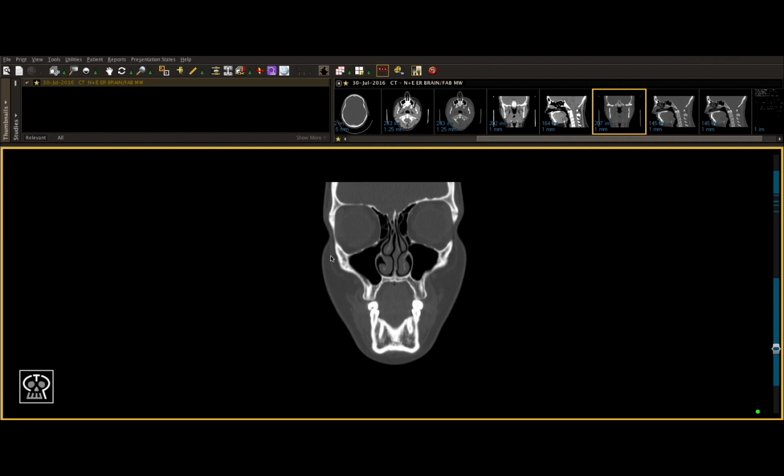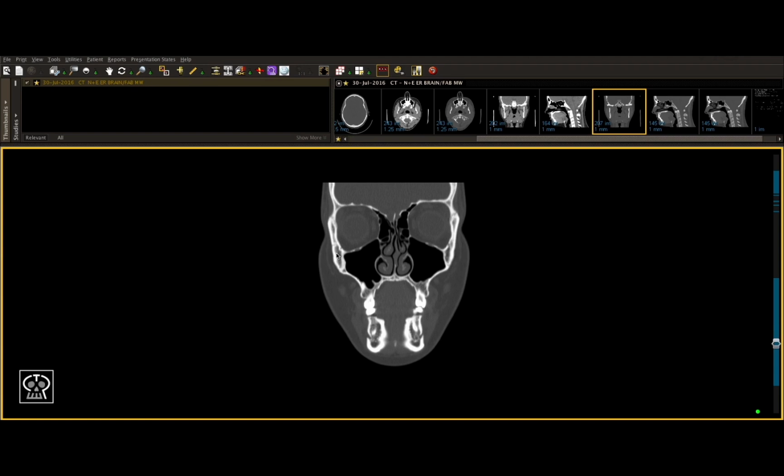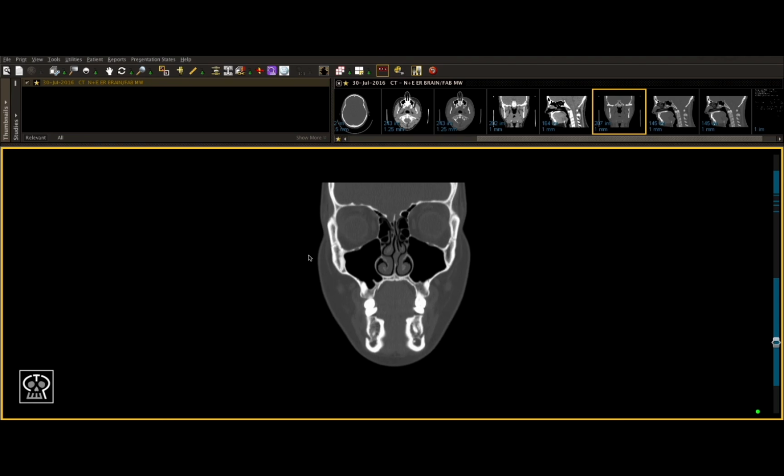These are all done one at a time, and as you can tell, there's an intricate relationship with maxillary sinus fractures, orbital wall fractures, and zygomatic arch fractures. This is why, once again, similar to your NOE fractures, you may appreciate one fracture at a time and then eventually describe it as a ZMC complex fracture.